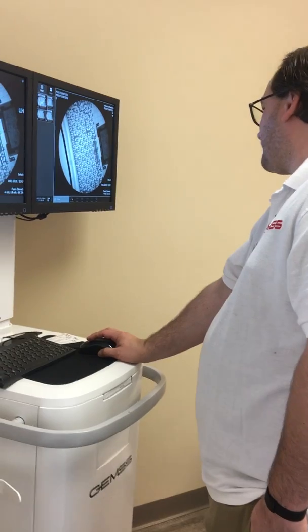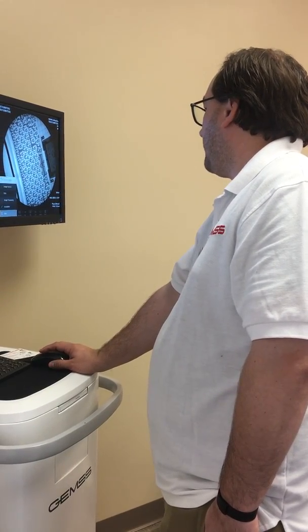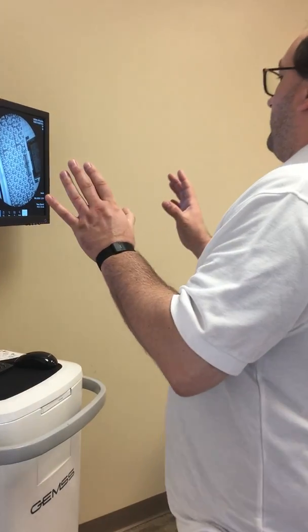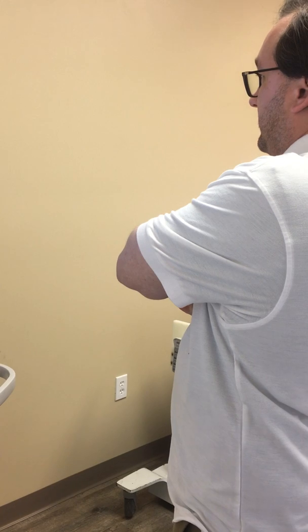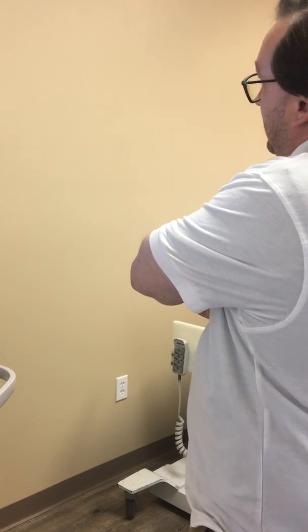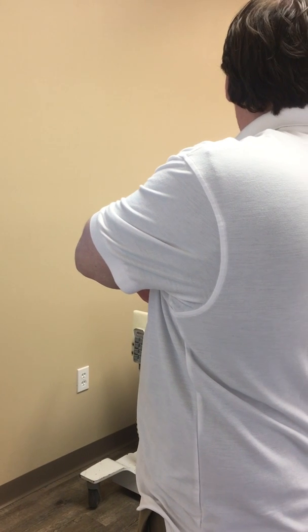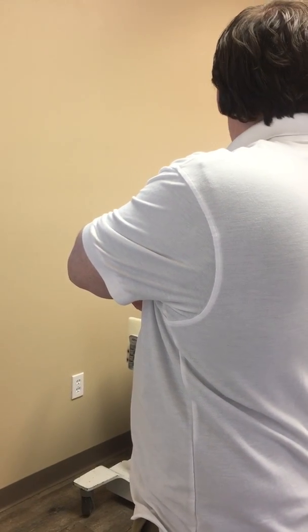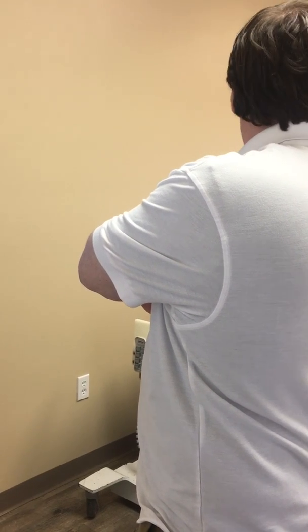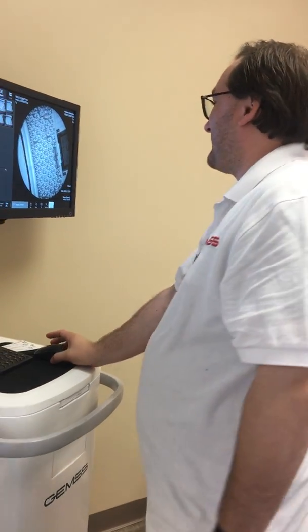And once again, if you get into using all the archival functions of the system and all of the data storage functions and the DSA Cine stuff, and you find yourself a month or 2 or 10 down the road needing some of these functions, you can call me and then we'll go over that. Because now it's just kind of excess information.